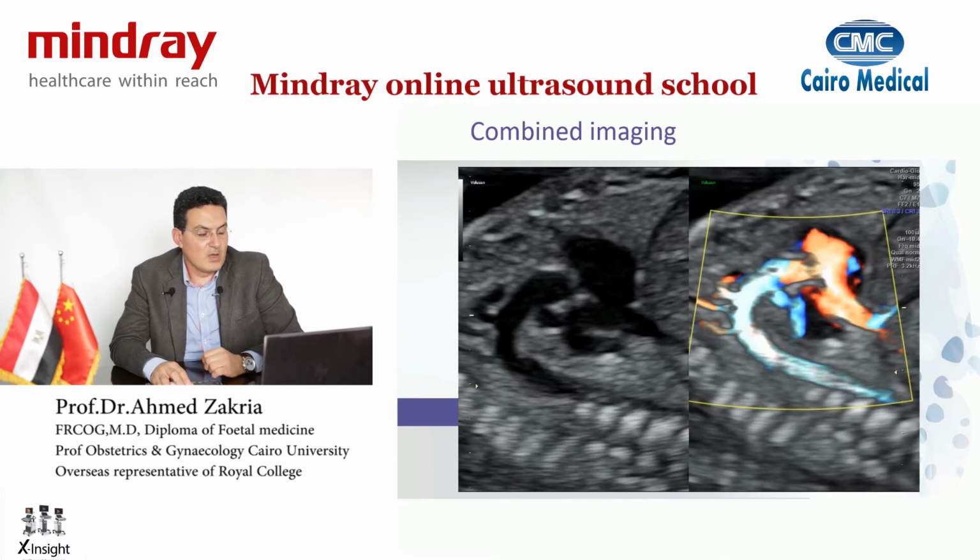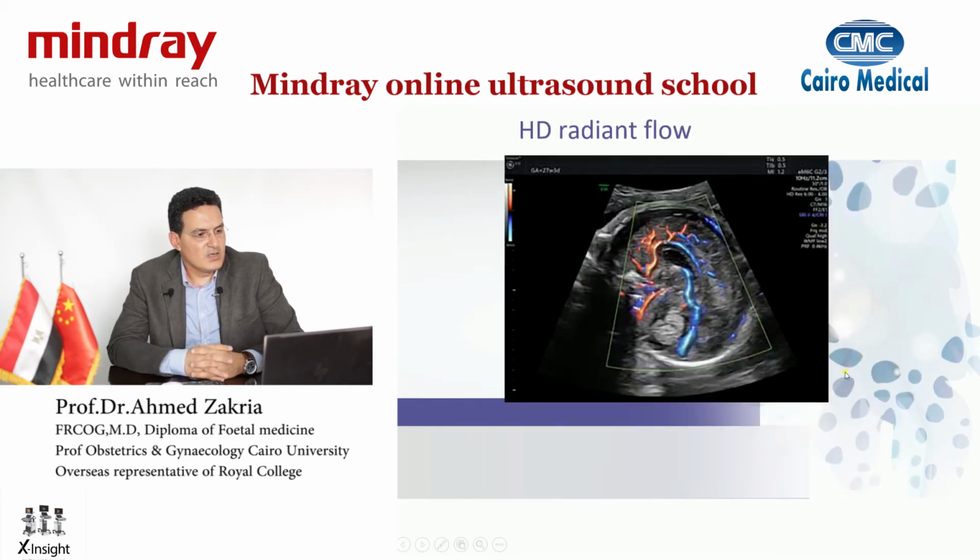Again, we can combine a thicker slice of 3D along with volume 3D imaging to get better visualization of the branches of vessels as they go and distribute across the tissues. Here, with a colored Doppler and a thicker slice, you can actually see the structures of the vessels moving all across the corpus callosum and giving all the branches, so you can actually define it quite clearly.